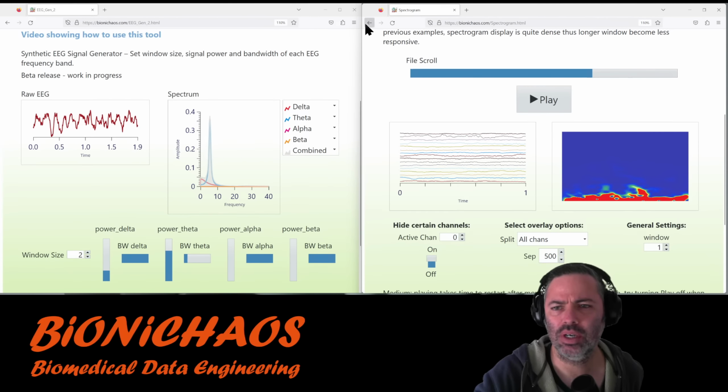So if you look at it closer, it will mostly take that second channel, just because it's noisier. So this frequency component there would probably be that spiky business here.